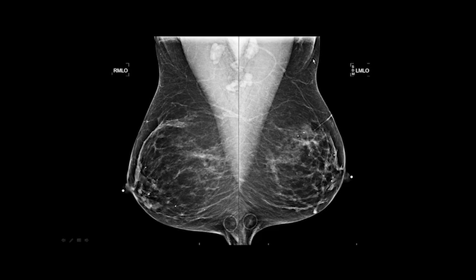See up here in the tail of the breast superiorly, there's a few little skin folds. It's not tissue fold, it's skin fold. Your technologist can try and get those out with her fingers when she's positioning, and to twist the arm posteriorly so the arm's not sitting on the detector, it's behind the detector. But you can see the structures in the breast.